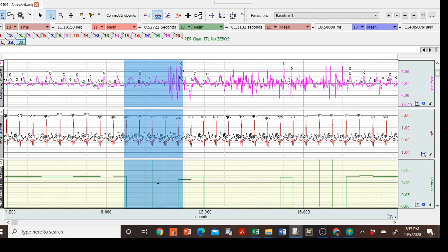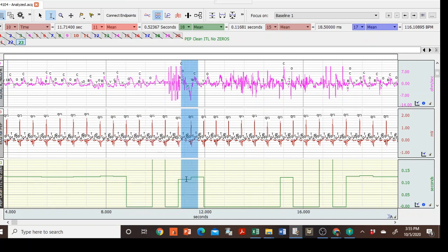Now, what often happens after a lot of noise is that when it starts to pick up with real data here, it becomes iffy. You see there's often a little bit lower value leading up to a bigger value. This lower value could be valid for this person later on in the sequence we're looking at. But right now, if you look up above where we've highlighted, this is a noisy little cycle.